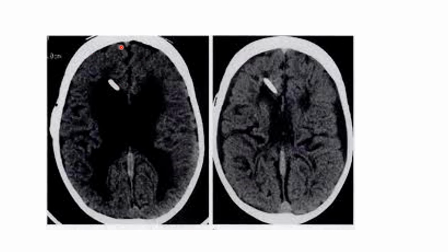So this cut goes through this end. If you go higher up with this cut, you can see, for example, this part of the shunt. And if you go higher up, you will see it there. But imagine that it goes from here to there, and connects to the valve here, just between the bone and the scalp, or inside the scalp layers, and it goes down to the peritoneum.